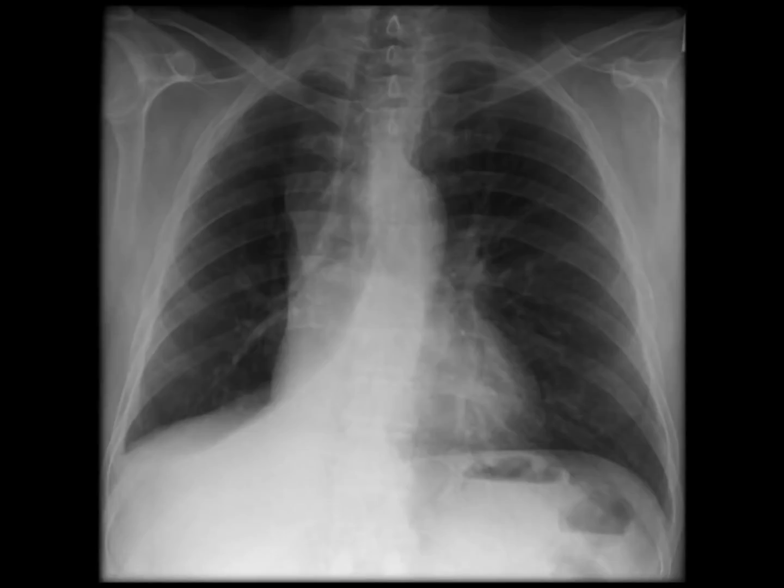Now we've reached the fun part of the video. Using the method I've taught you, it's your turn to try a couple of practice examples. Pause the video at each image and write down your findings. And if you're feeling clever, you can make an attempt at diagnosis. Pause the video now. The first thing you probably noticed is that there's an abnormality on the right hand side, so let's move on to the details to figure out what's going on.